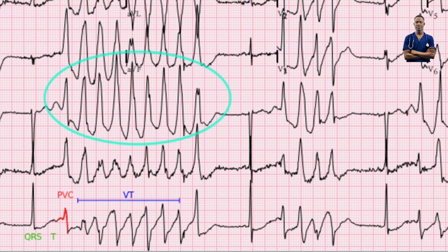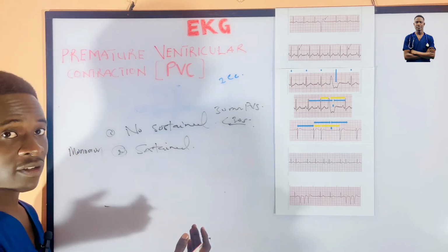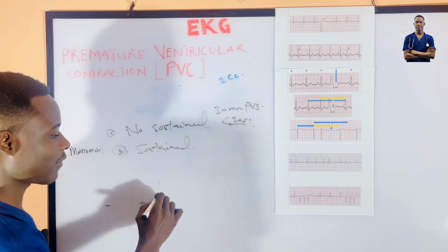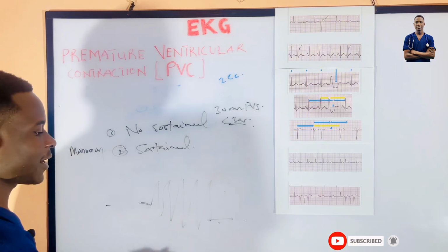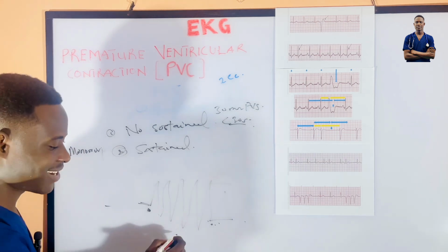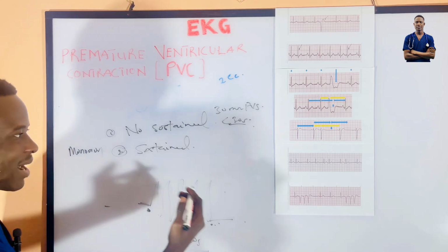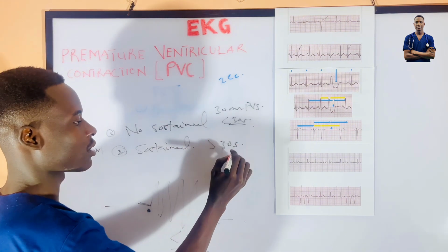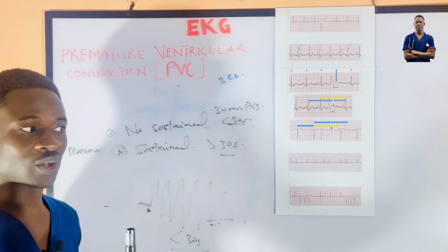So when the time taken is less than 30 seconds, for example, the extrasystoles generated are about 5 continuous. When you check the time taken from the first one to the 5th one, it is less than 30 seconds. So it's non-sustained. Are we clear with it? But when it is more than 30 seconds, that is what we call sustained.